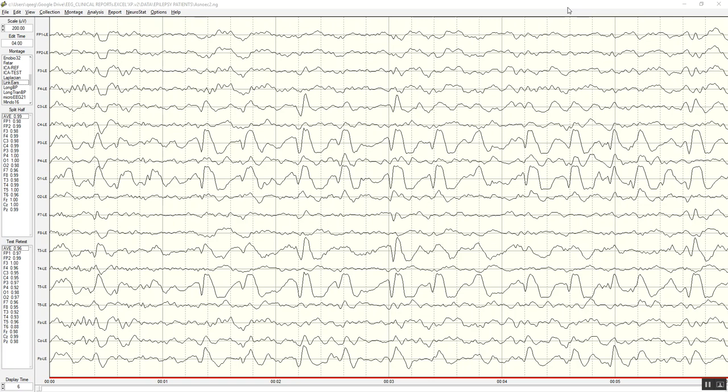This is a 12-year-old child that a neurologist, as part of a team at Massachusetts General Hospital and at Harvard, sent me data because they were trying to evaluate whether or not to do neurosurgery to remove the epileptic foci. This child had arterial malformation that resulted in the left hemisphere spike and wave that you can see here.